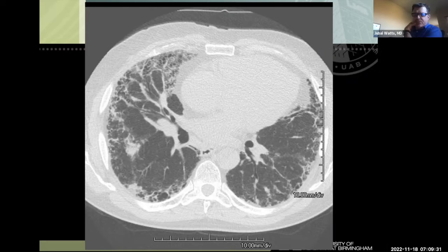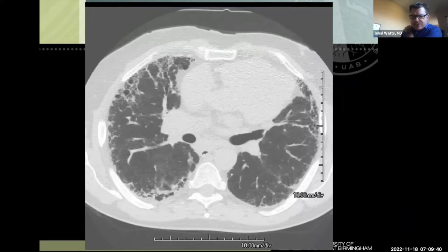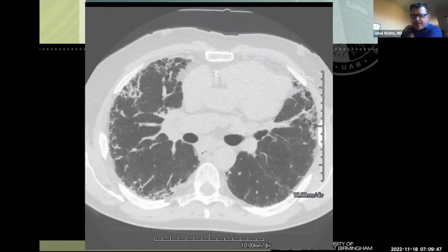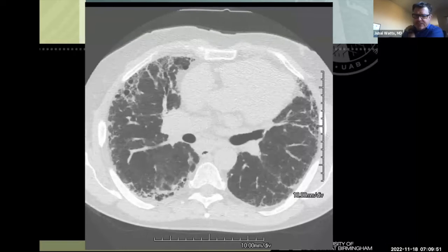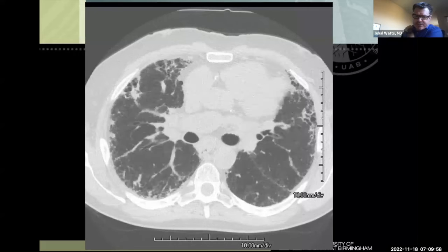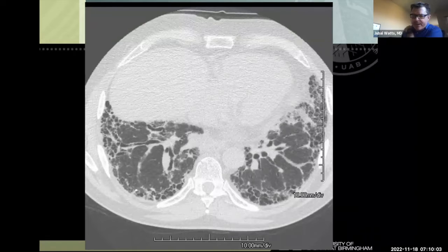Histopathologically, that corresponds to microscopic fibrosis, microscopic honeycombing. And so for you to have ground glass that would make it inconsistent with UIP or suggest an alternative diagnosis, you need to see it clearly away from areas of honeycombing. ATS in their original guidelines said it has to exceed the areas of reticulation. Fleischner Society says you need to see ground glass clearly away from areas of reticulation to call it inconsistent. So this is a typical UIP pattern, spatially and temporally heterogeneous.